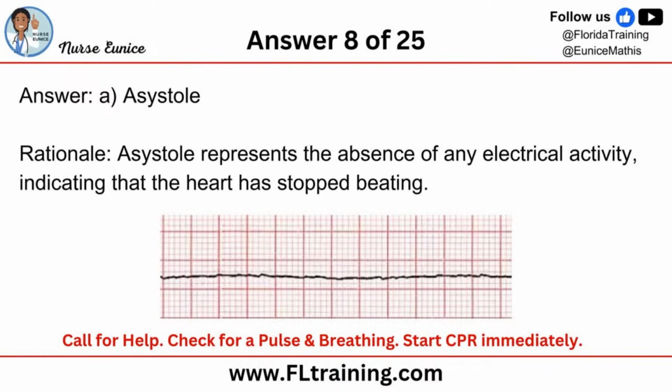The correct response is A, asystole. Asystole represents the absence of any electrical activity, indicating that the heart has stopped beating. A being absent. Remember prefix, if it has a or an in front of a term, that means the lack of. And so if you see this on the monitor, you're going to call for help, you're going to assess your patient, you get 10 seconds.